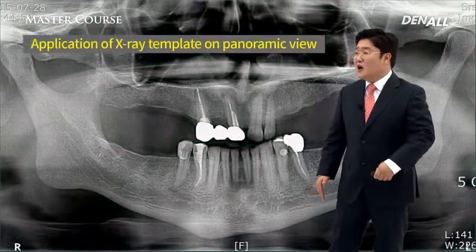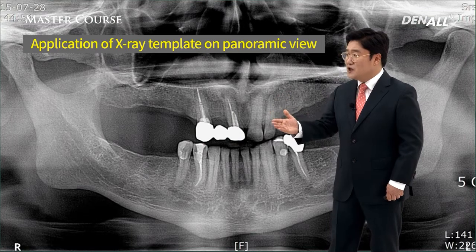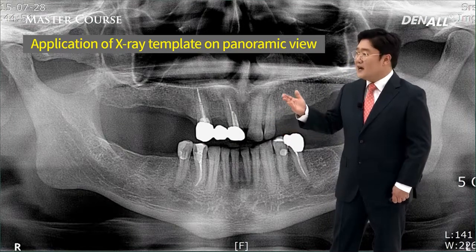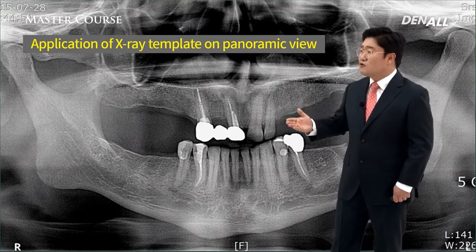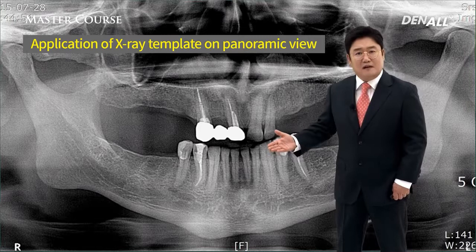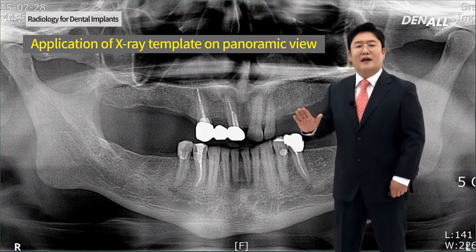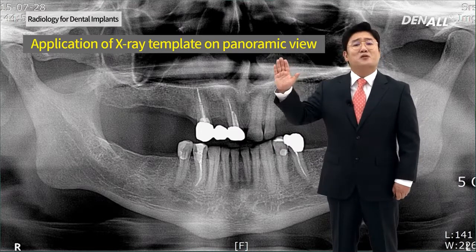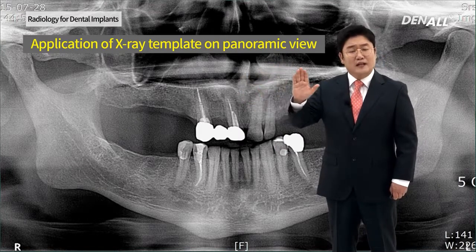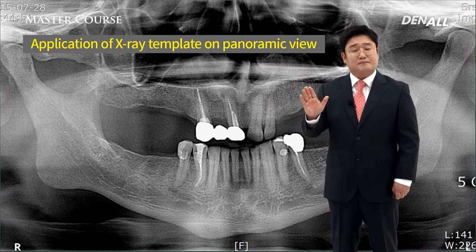How can we use such X-ray templates? Implant surgery is planned for this patient in this case. Upper posterior, lower posterior regions, implants will be placed there bilaterally. What process did we take in the past? The first thing we had to do was to take panorama pictures because panorama pictures were the basis of all implant procedures.